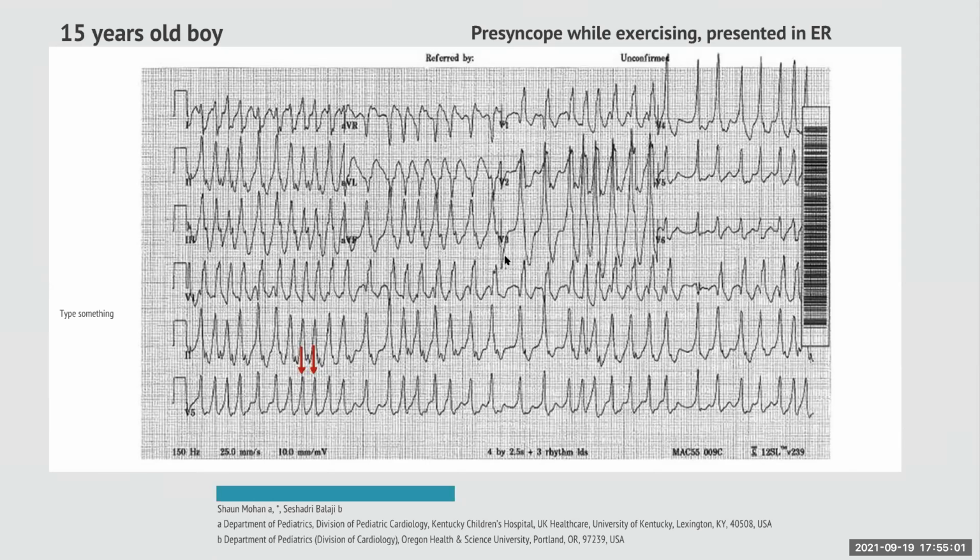It looks broad. Yes. So someone says narrow. And this is absolutely perfect. Somewhere it looks narrow, like here. Look at the aVR. It looks a bit narrow here, but in some it looks very wide. Okay, so you have wide QRS and you have narrow QRS as well. Now, wide QRS, no P waves, irregular rhythm. This is looking very irregular, so it has to be atrial fibrillation. Now we go through the nitty-gritty of why the QRS looks wide in some and not wide in others.